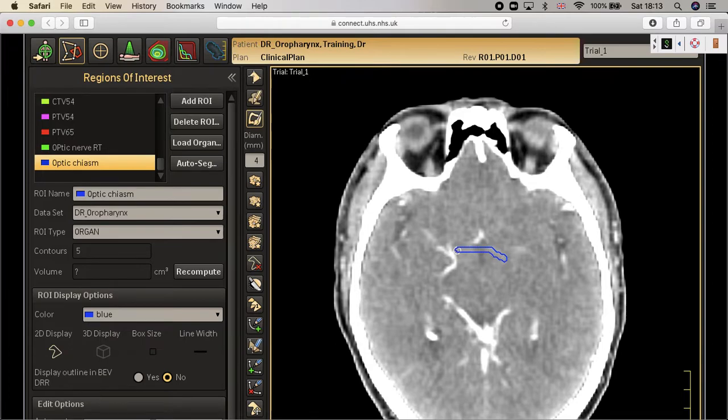I can do that, but just don't join in the middle, because we know that the optic tract should not be joined in the middle, because all the optic tract will go on either side, and will be the optic tract, and that's it. You don't have to worry about it. So now we draw the optic chiasm. We want to make sure that we draw it in the right direction.